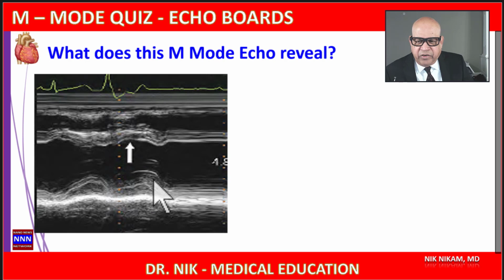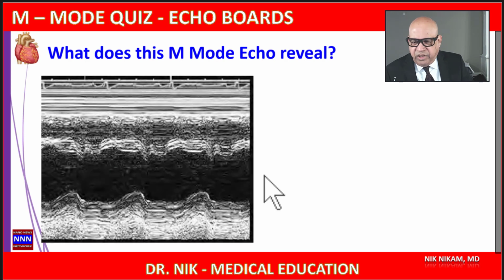So it depends upon the sequence of activation of the ventricular walls in patients with conduction disturbances or when there is an ectopic beat. What do we see here and what is your diagnosis? Pay attention to all the structures. As I said, it is important.